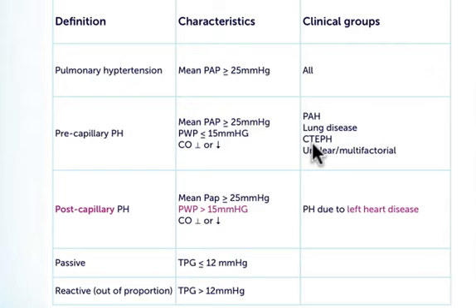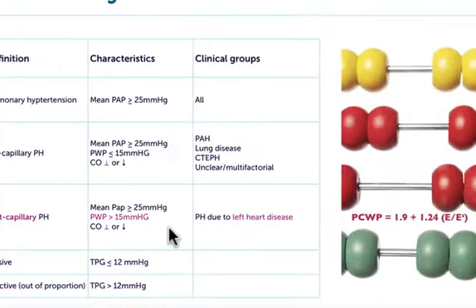The question really is how to assess pulmonary wedge pressure, and you certainly know that you can do it invasively by right heart catheterization, but you can also use echo. And I've shown you, for example, this formula on the right side that gives you an estimate of the wedge pressure using Doppler measurements like E/e', multiplying it by 1.24 and adding it to 1.9. While other methods, newer techniques like strain or strain rate, are supposed to help you and give you an estimate as well.